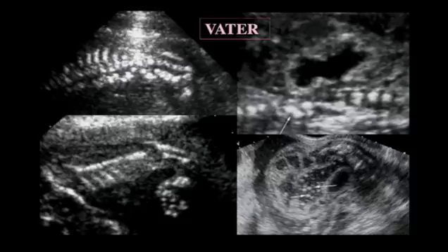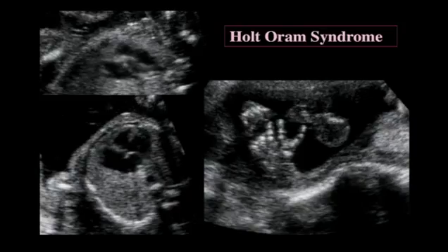So this can be construed as a very good sign of anal atresia in this case, which would make this compatible with Vater's association. Here's a fetus that had Holt-Oram syndrome. One parent had it, and sure enough, the hand is very abnormal. There is no thumb here, although there is an extra digit, but these are all digitalized. There's no thumb that opposes any of these. The heart is abnormal. There's a large VSD and a small aorta.